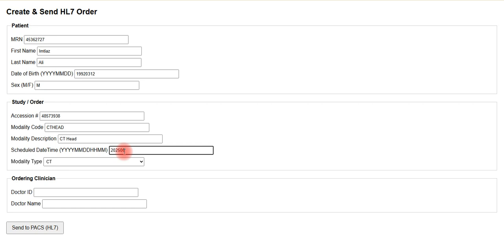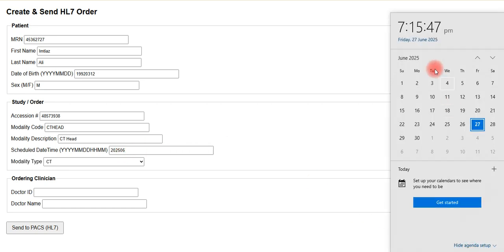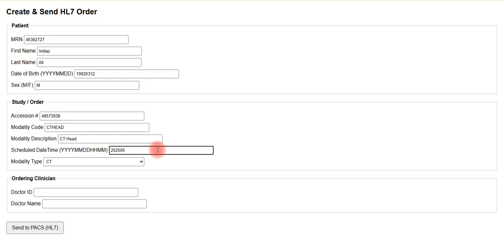Today is the 27th of June, and let me show you the time also. You see, Friday 27 June, 7:15 p.m. is the current time. So for 06, I will set it at 10 p.m. So we will write 22 for the hour, and the minutes will be 50, so 10:50 p.m.